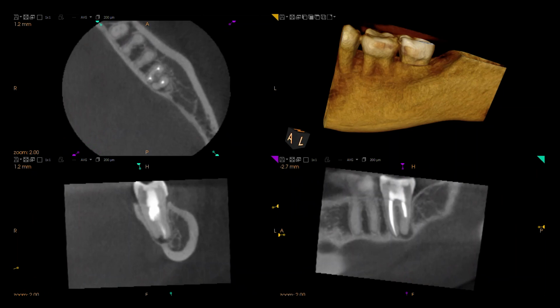And if we measure the distance, how far do we actually have to go to get to this root, we're looking at probably 13 or 14 millimeters in to the mandible to be able to actually reach this root. And even if we did and we decided we're not going to treat it, we're just going to resect it, we'd have to resect it probably up at this level, which would certainly compromise the length of the distal root probably to about this level.